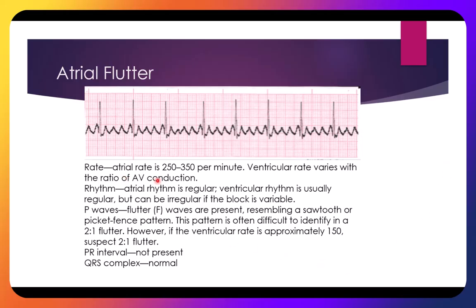But let's look at our atrial rate. Each one of these impulses that we see here is an impulse that is coming from someplace in the atria trying to cause the entire heart to depolarize. Let's imagine this is a 6-second strip, and let's count and see what the atrial rate is.